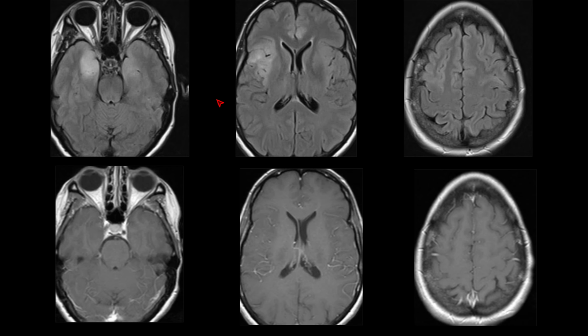And so this patient had a biopsy-proven aggressive glioma in a gliomatosis cerebri growth pattern. I really don't think there's any way anyone could know that this was not autoimmune limbic encephalitis just by looking at the imaging. So this is one of those very bad mimic cases, and I think it's just a shortcoming of imaging.